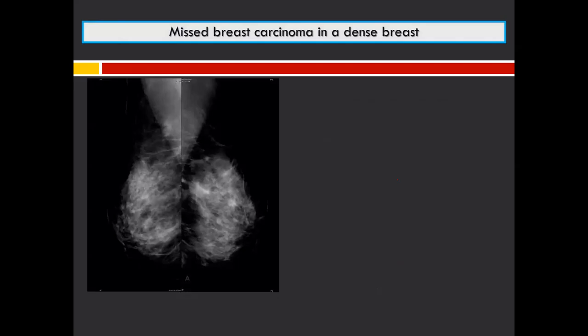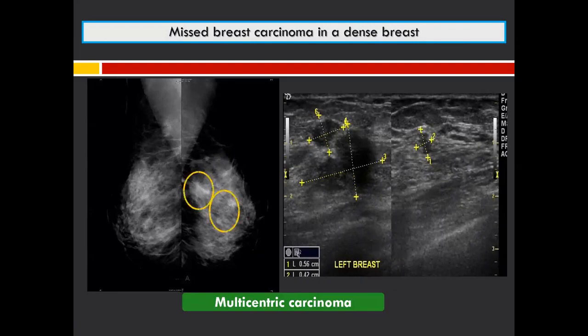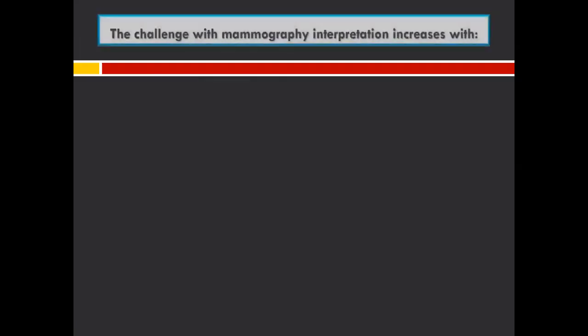And this is one applied example which shows us the real limitations of mammography. In this heterogeneous dense breast parenchyma, we can see nothing, although clearly on the ultrasound examination, we can see multiple variable-sized hypoechoic lesions, which proved to be a multicentric carcinoma, and they can hardly be seen within the mammogram of the patient.